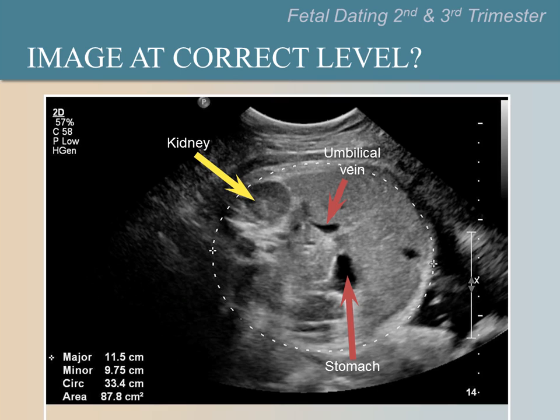The answer is that this is a kidney, which means that this is the wrong level to measure the abdominal circumference.